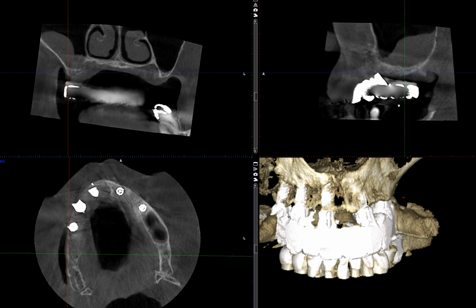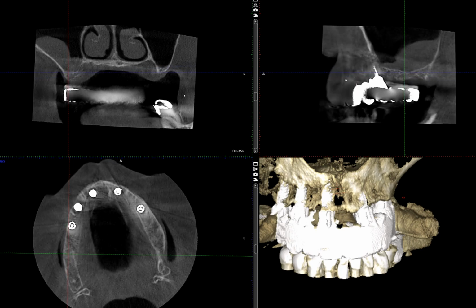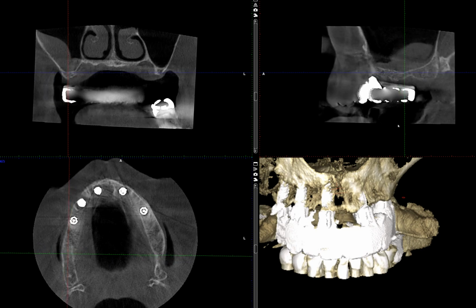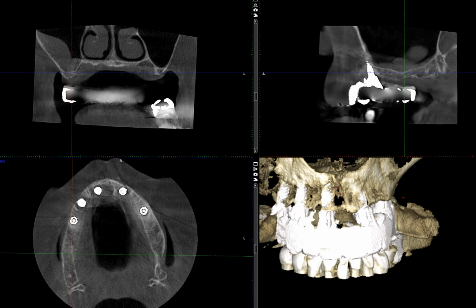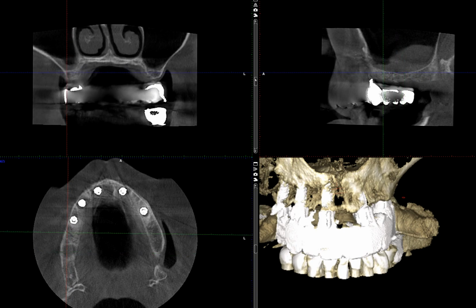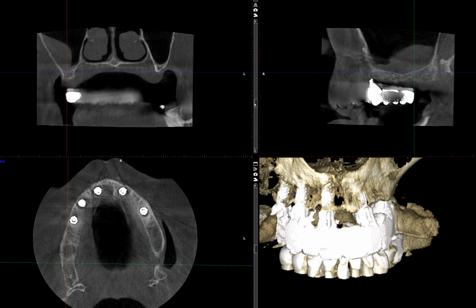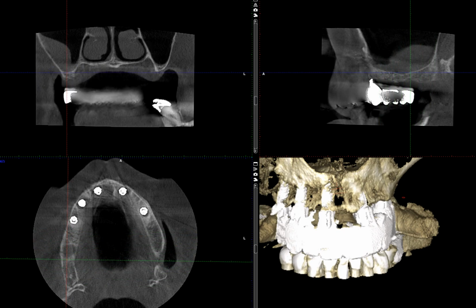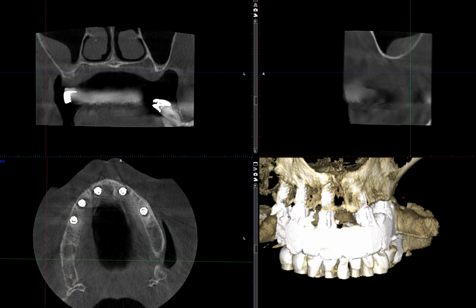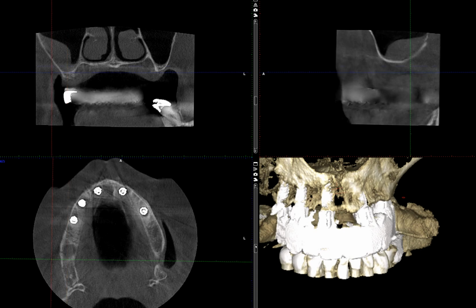And if there were teeth in this area, testing for vitality would also be important. However, in this case, the patient is edentulous. So given all the radiographic features and the consideration, this is definitely a mucous retention pseudocyst, and I hope to once again go through this in 3 different planes. And lastly, axial.